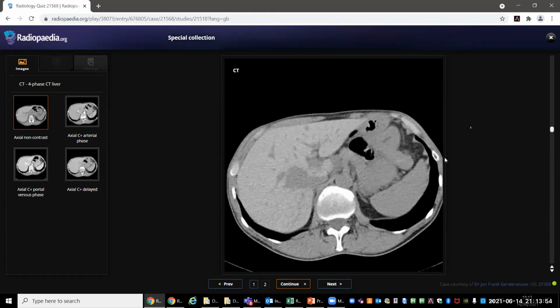Okay, if you're thinking amiodarone, is there any other thing you would like to look for in this study to support your thoughts? Then I would like to look for the visualized lung bases in lung window and the part of the heart, if they are visualized on the scan. What are you looking for in the lung bases? Some sort of lung fibrosis, okay. Basal lungs.